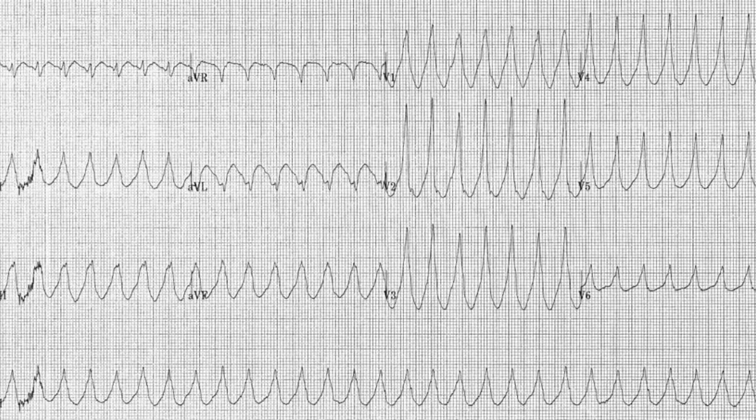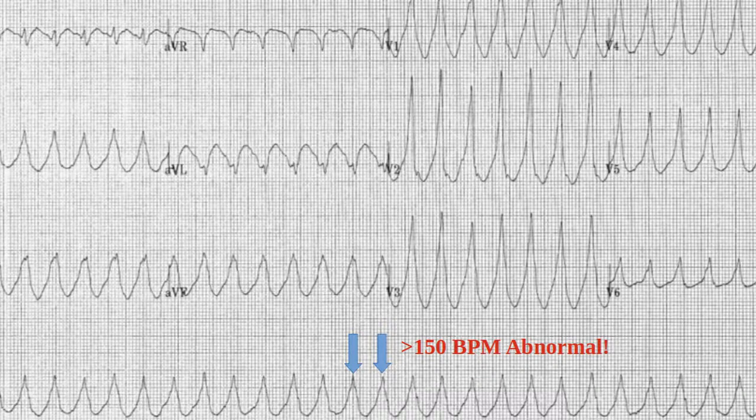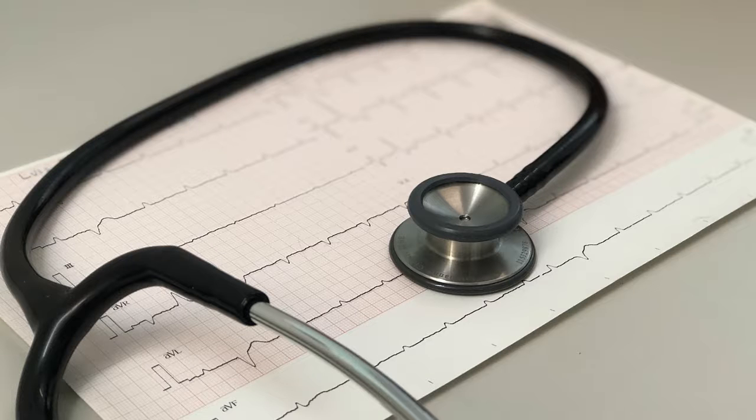One more, please, Neil. Do you have a patient whose heart is too fast? Yes, here's a patient with tachycardia. Can you figure out how fast his heart is beating? Wow, less than 2 big squares between his R waves. That means his heart is beating faster than 150 beats per minute. I would call Dr. Sutton right away. I think you've got the hang of calculating a heart rate by counting the large squares between the R waves, Teresa.